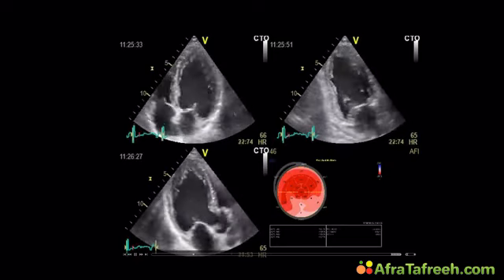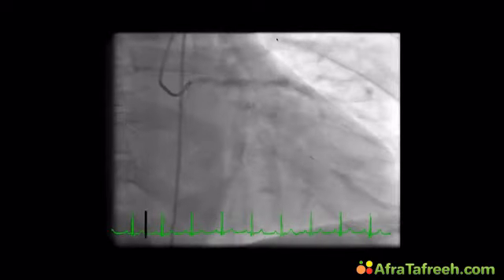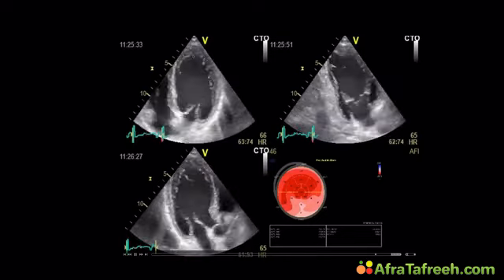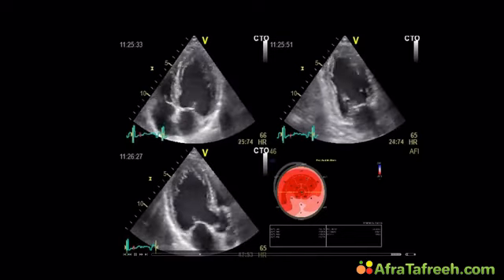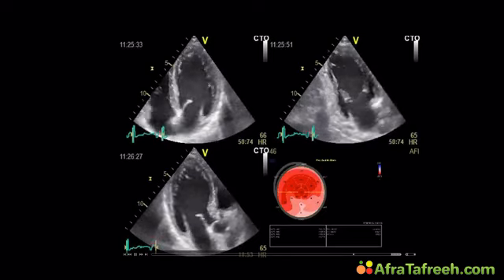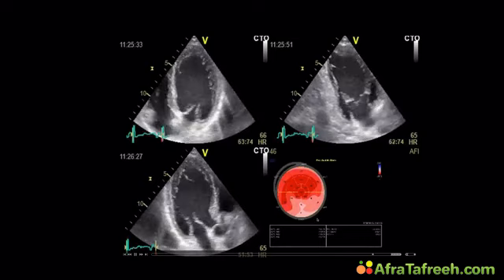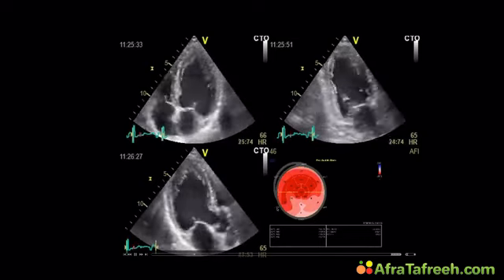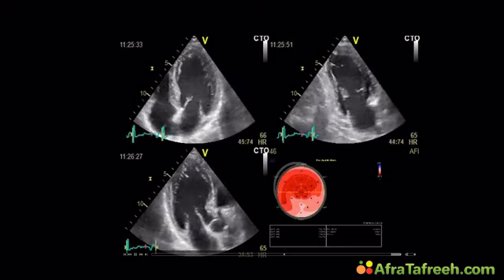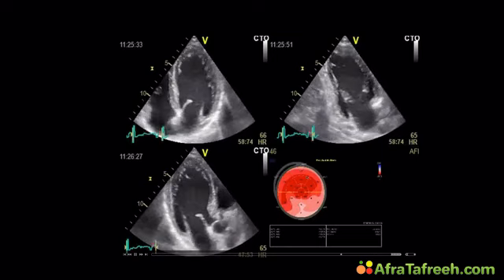You open it up and fold it up, and you look at the ventricle from the top, and the center regions would then be the apex. This would be the mid segments, and those are the basal segments. You have labeling here on this bullseye view which tells you what is where. This is inferior, posterolateral, lateral, and thereby you can describe all the different segments that there are.